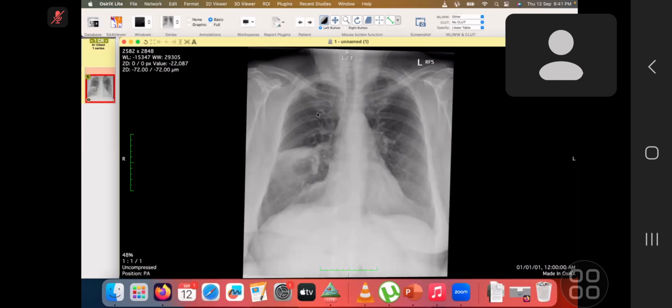Okay. So I'm presented with a frontal chest radiograph in a skeletally mature patient, and the patient has presented with a dry cough. Within the right midzone, there is a thick-walled cavitating lesion with surrounding airspace opacification. There's no associated pleural effusion, no underlying bony rib erosion that I can see, and no bony lesion or deposit within the visualized bones. This is a solitary lesion. I can't see any other lesions anywhere else.